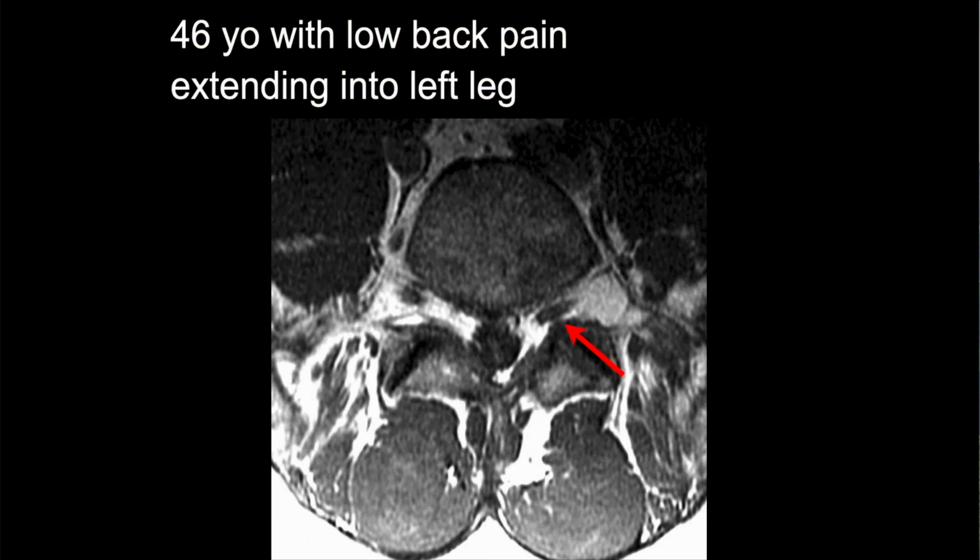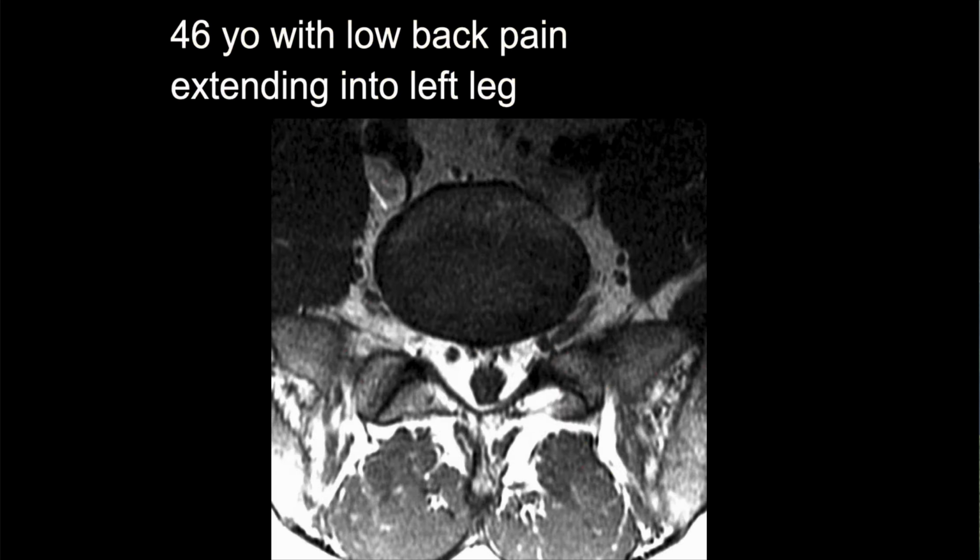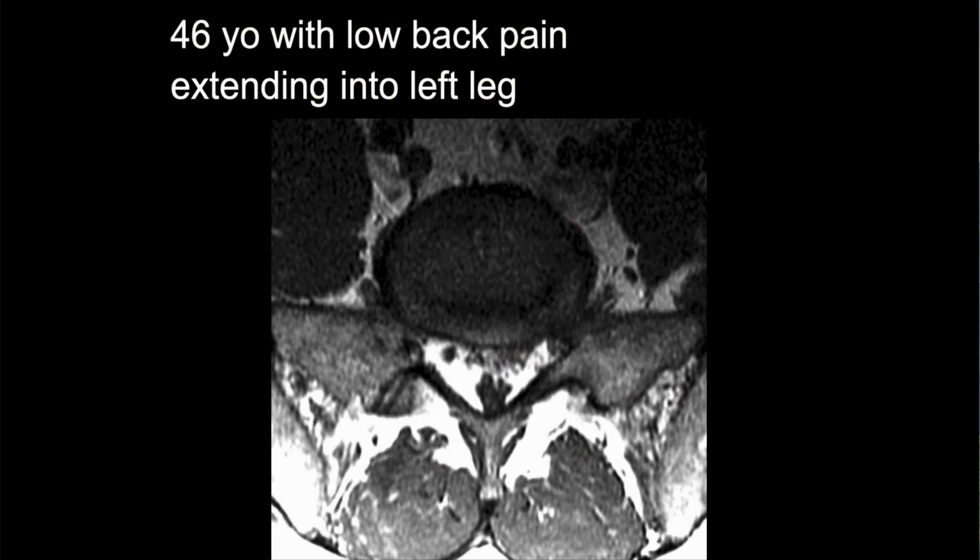So if we go to the next cut, notice what it looks like here. It's like there are two nerve roots here, but only one there, and then something else coming off the thecal sac here. Bringing the asymmetry. So this is normal on this side. This is abnormal on this side. Any ideas? It's not rare. This used to be something that's kind of important to mention if somebody's thinking about surgery. And then here we can see asymmetry.